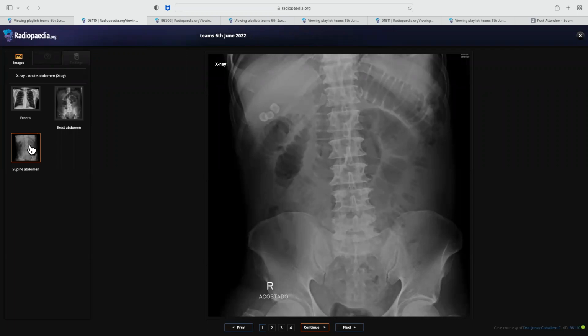I would urgently discuss this case with the referring physician and refer it to the surgical team. I would also advise a CT scan of the abdomen, including the chest, to rule out the cause. And as you say the patient already has a known disease, I would look into the records to check the details and also compare the scan.